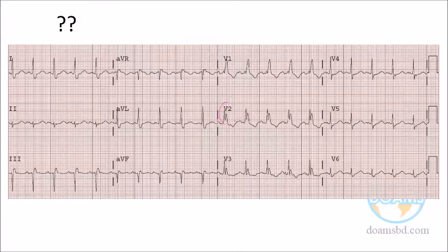No, sir. There is no S. I told you S should be below the baseline, negative, depression below the baseline. So, Ankit, clear? This is only RR, double R, because of fractionation. Fractionation, right? Good.